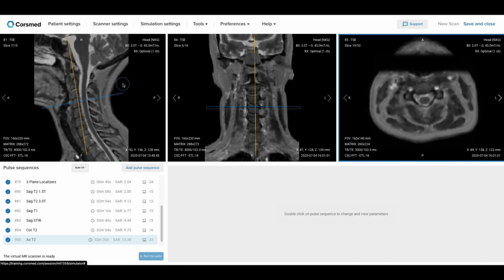Remember that T2 weighted images are fluid-sensitive contrast, so they'll highlight the cerebrospinal fluid across the 3 planes and help us detect pathological changes involving fluid and soft tissues. This helps us check for pathologies like spinal cord compression, disc herniation, myelopathy, or cord edema.